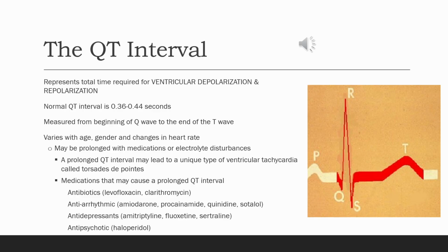And this is a polymorphic ventricular tachycardia, which I know is lots of big words I'm throwing at you, but rest assured we'll talk about some of this later on in this lecture. But it can lead to a cardiac arrest.